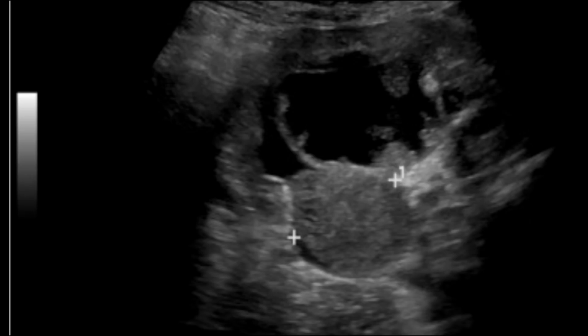Here on this particular image, Wilms tumor is shown, and this is a predominantly solid spherical lesion. As far as internal echotexture is concerned, you can label it as slightly heterogeneous. This is small in size, and besides this you have to pay attention to whether it has any compression effects on the pelvicalyceal system or not. The second thing is you have to look at which pole is involved, the upper pole, middle pole, or lower pole. In this case, it would be the junction of the upper and middle pole.